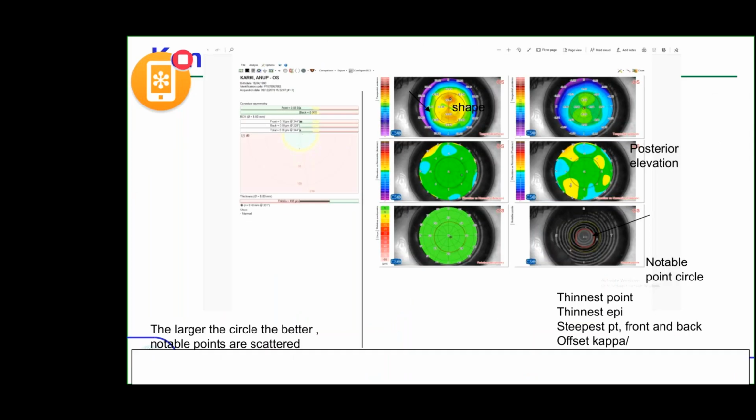So before we go to the elevation map, all right? So this is a cornea. This is an ectasia reading scan, okay? It analyzes the keratoconus. So keratoconus analysis is by this scan. They use a lot of things now over here. They use what is called the Belin-Ambrosio data that takes in two types of data.